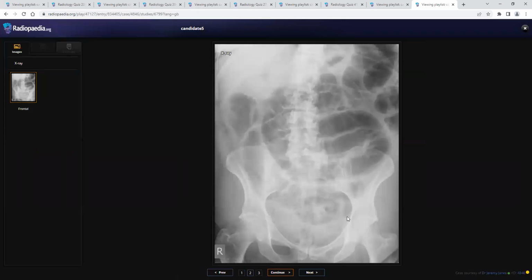Now this, you were right. This is a case of obstructed bowel with pneumatosis and perforation. Okay. There is no hernia. You are right at pointing out the hernial orifices and also the liver shadow to look at the portal venous gas. But you can see the Rigler sign here. Can you see both sides of the bowel wall? On either side, you can see the lucency. That's the Rigler sign. You can also see here. So this is a perforation, small bowel obstruction, pneumatosis, and perforation.